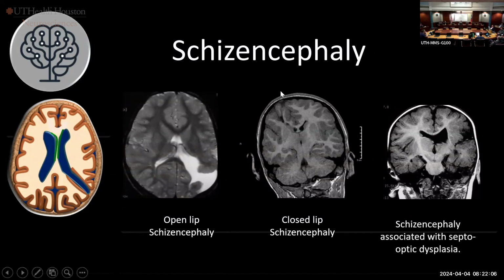So when schizencephalies are like this one, with this very thick nodular heterotopia, it's very easy to see. I find myself a lot of the time with these very thin ones that it's not clear if there's cortex in there. I don't know, Kate, if that's the case for you, but that's something we see all the time. So this is an open lip. Remember that this is pia right here covering this, so there's no communication. So these are open lip and closed lip.